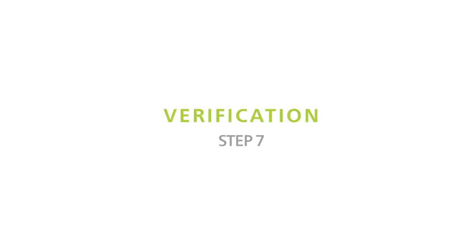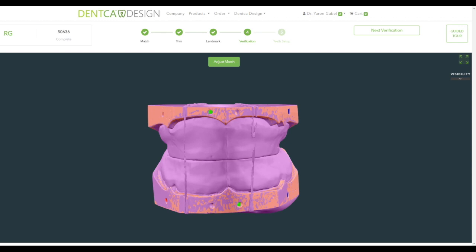Verification. During this process, you will verify the matching, trimming, and occlusal plane placement. You may rematch or retrim as necessary.